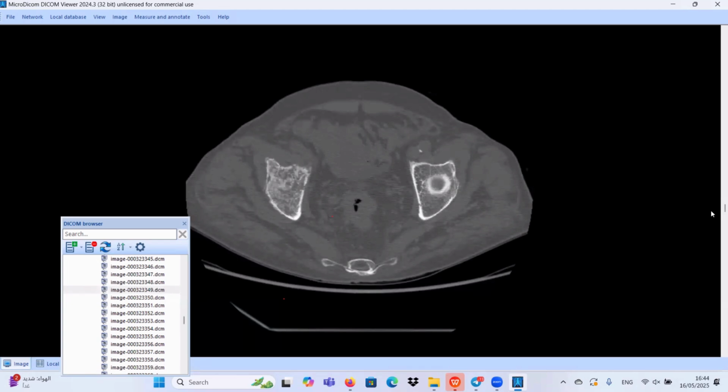Sir, can you show me the prostate? Okay. Let's go to the soft tissue.